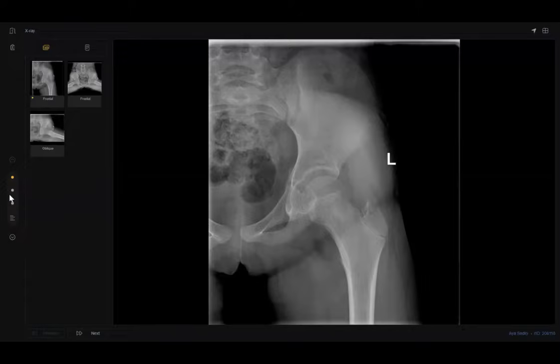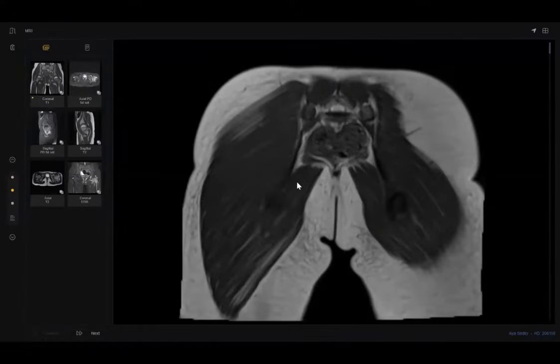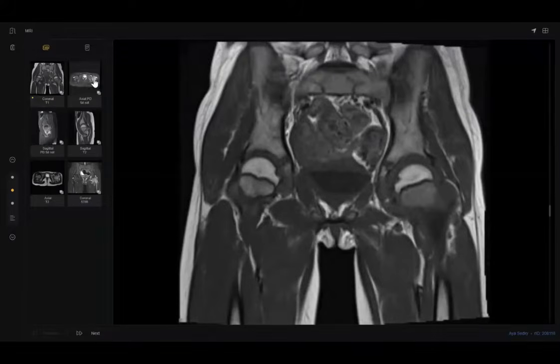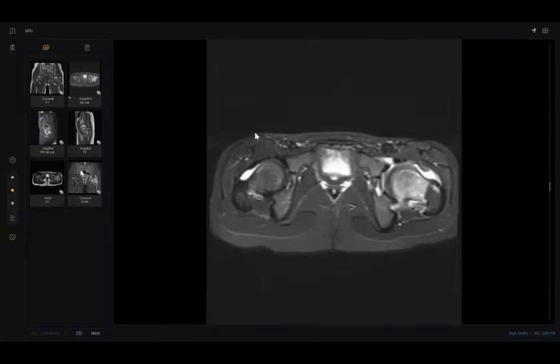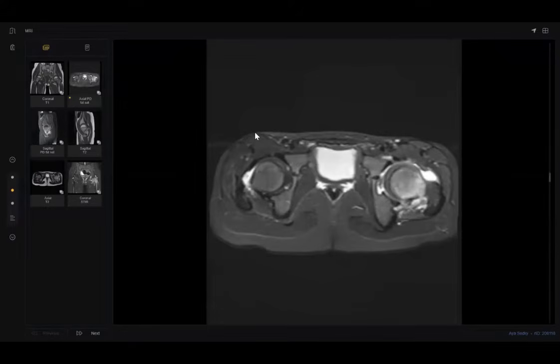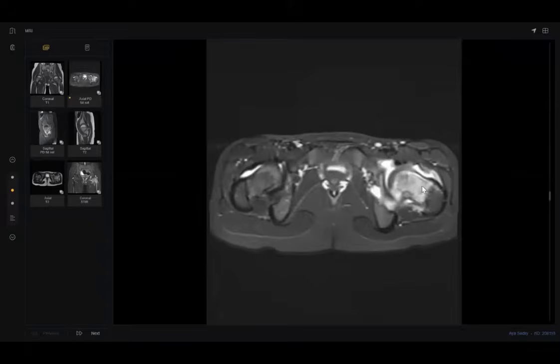Okay, next point here, MRI. Please, my colleagues, when the examiner gives you a sequence, smash and squeeze all the possible findings. Why? Because the answer is in the first one.